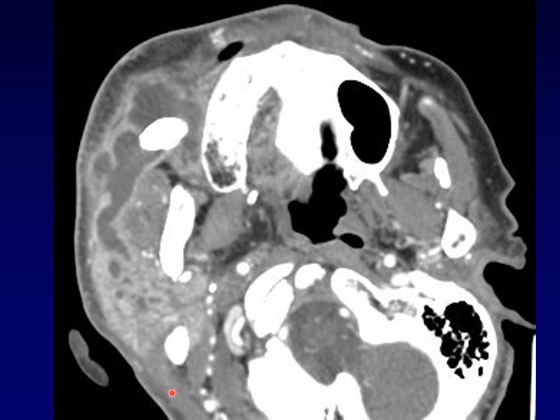Stone causing an infection. You can see this large calculus, probably 1.5 centimeters, obstructing Stenson's duct, and the duct itself has become enlarged and has abscessed. You can see the enhancing wall, and all of the ducts inside have become infected and obstructed. A classic appearance for sialolithiasis causing sialadenitis. It's not usually this extreme. Another important finding is the infiltration of the surrounding fat, which confirms that we're dealing with an infection and not a tumor.